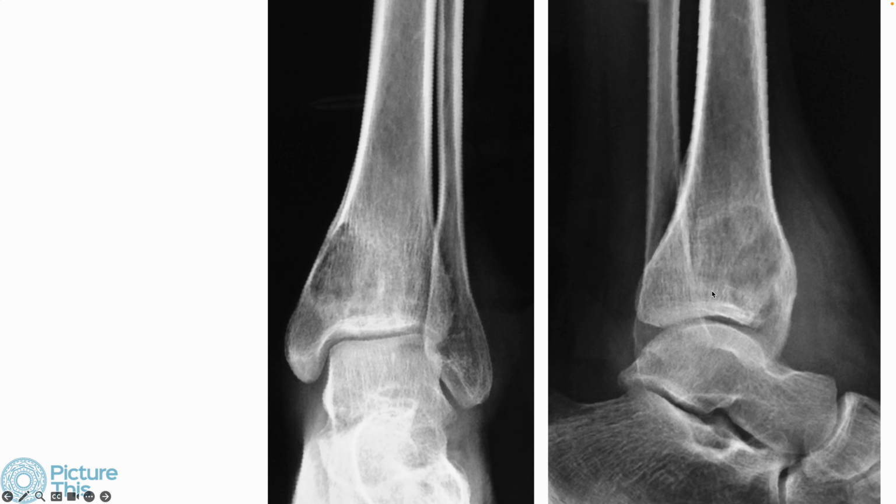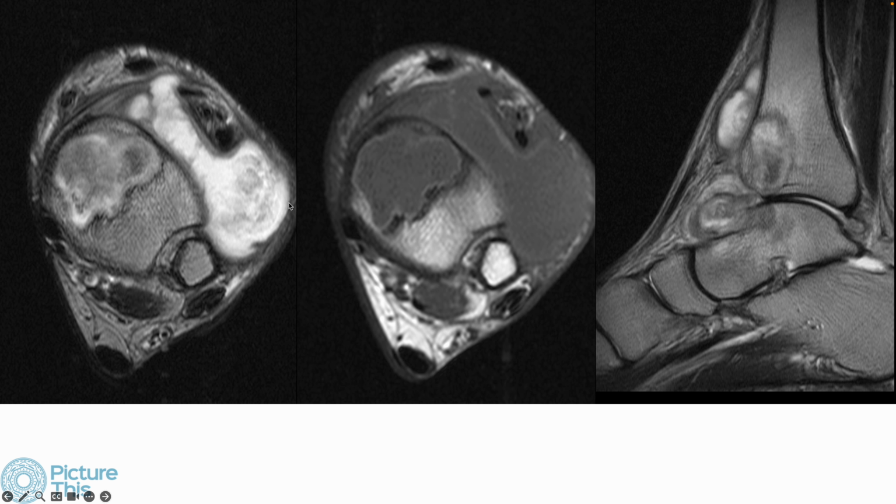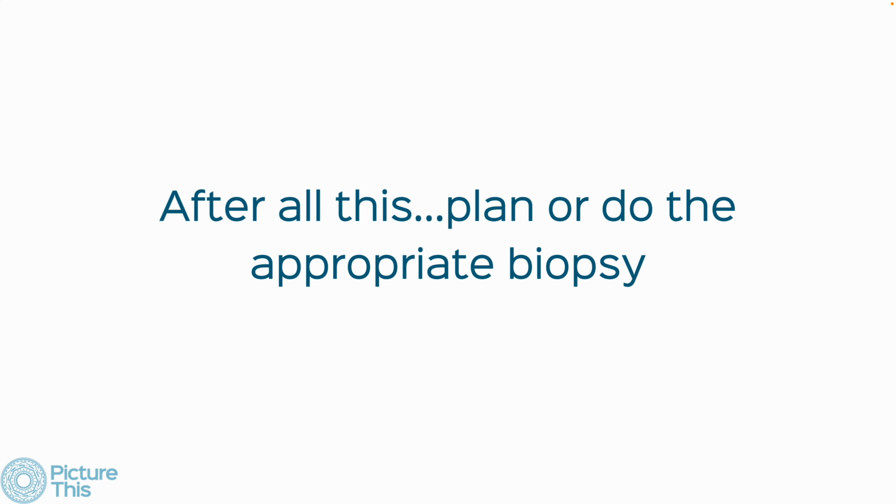Obviously, we should look for infection and mimics. Here is an osteolytic lesion. There is sclerosis, but it's not a sclerotic rim. There is a mildly thick periosteal reaction here. But you also see on the MR a large soft tissue component. It's T1 bright walls, which we normally get with infection. So this is highly suggestive of osteomyelitis, perhaps tuberculosis. And obviously, we're going to aspirate and biopsy this lesion.